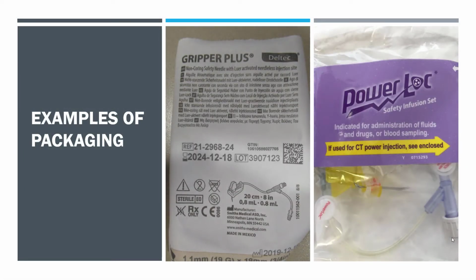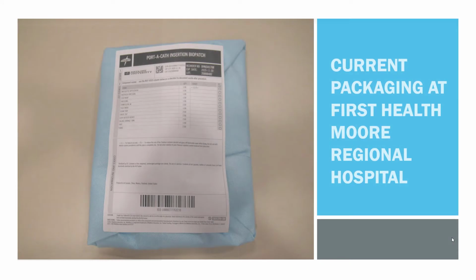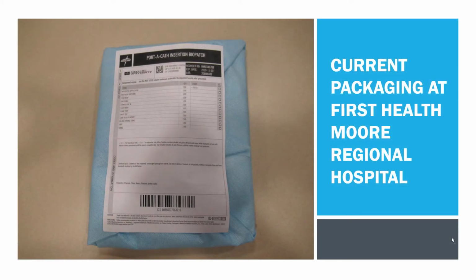These are a couple of examples of the packaging that you will see. On the right we have the power lock, and on the left we have the normal Huber needle for regular insertion. This is an example of the current packaging of the portacath insertion kit. It's a sterile kit. It comes with a biopatch, and this would be from medical supply as well.